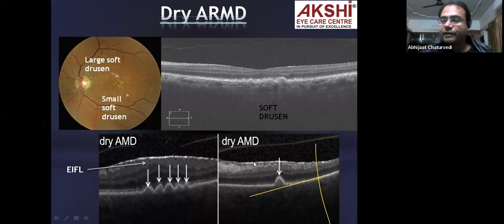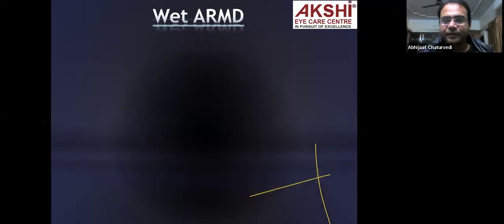So yeah, he can be taken up for a vitreoretinal surgery, and removal of ERM can be warranted. But once you go for that surgery, still the patient's vision will be affected because of these sub-RPE bumps. So this is nothing but dry AMD, where in the retina there's no fluid. Just these bumps are there.